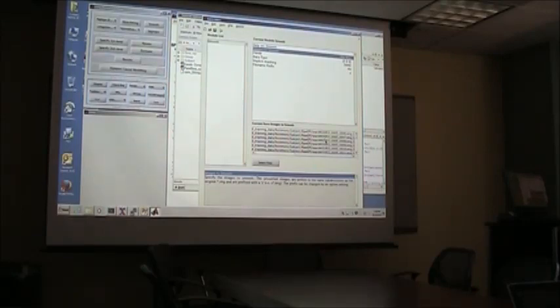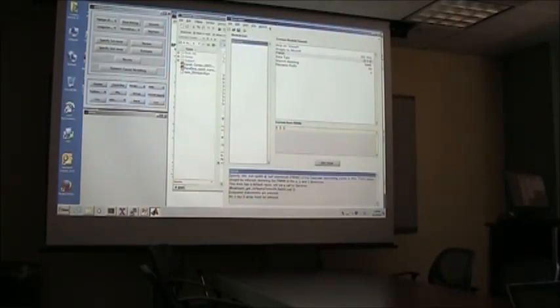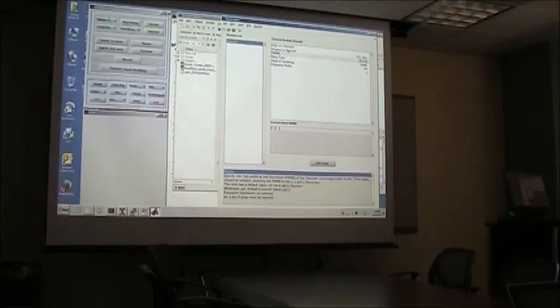You would load them all up by selecting files. You would choose a certain smoothing kernel. You can stick with the default of 8 millimeters, and the other settings you can just leave as they are. And then you can just run this.